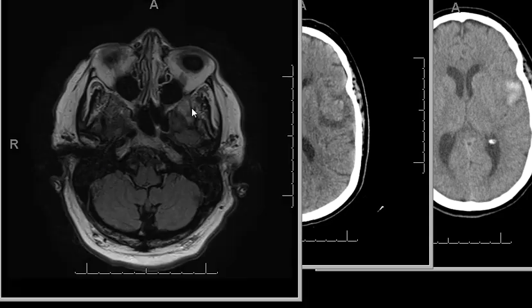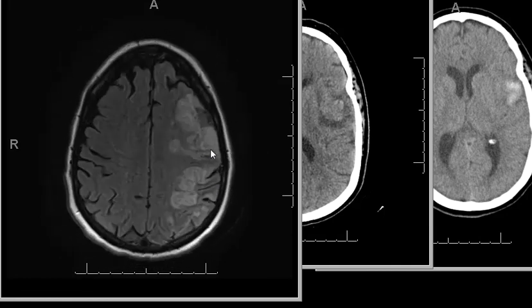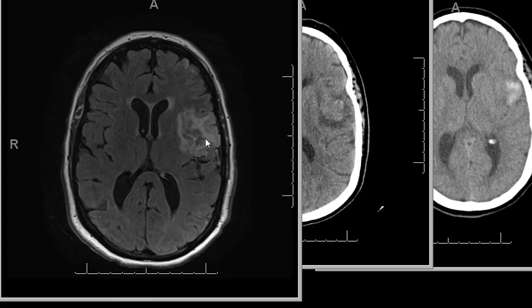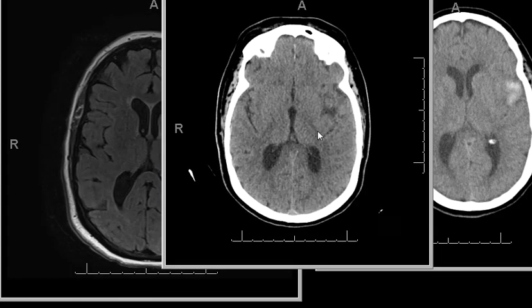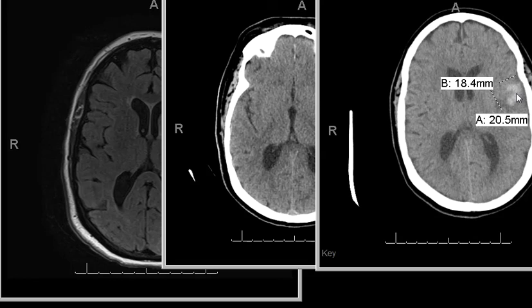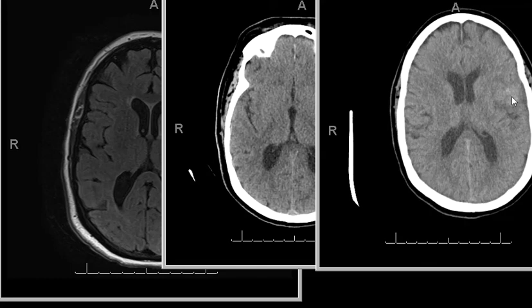The MRI showed the ischemia, cortical ischemia, and stroke, but no hematoma. A hematoma usually doesn't follow the cortex like that. It should look like a ball, maybe onion-shaped or heterogeneous, instead of this kind of gyriform density.